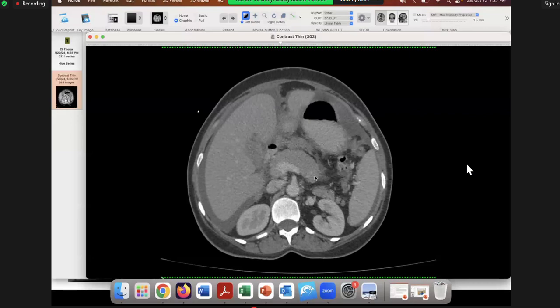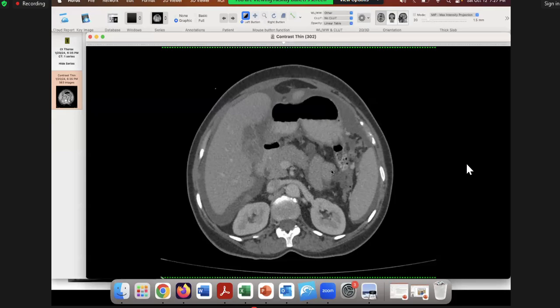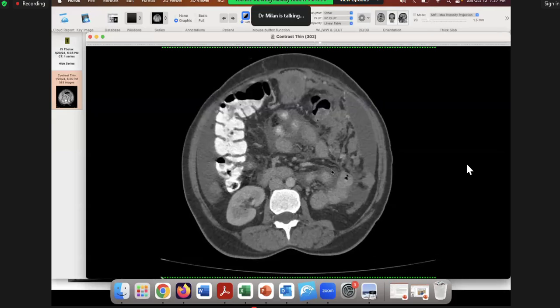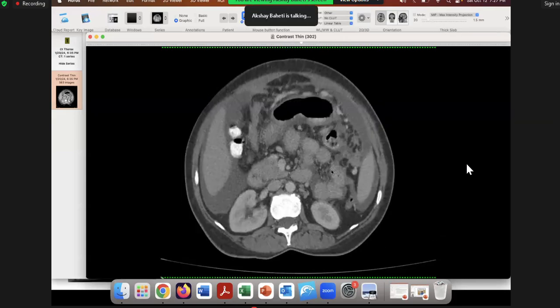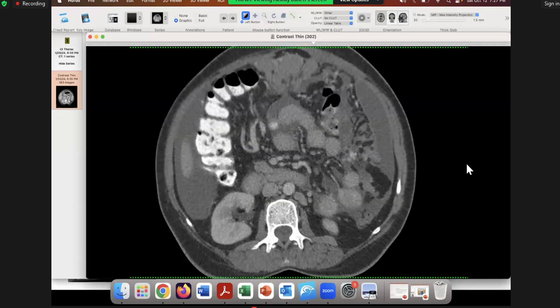So now let's also look at RP, retroperitoneum. What do you think? There are enlarged retroperitoneal nodes. Yeah. So what is enlarged? What is the cutoff? More than 9 in short axis. Okay. 9, 10, right? I mean, generally it's a centimeter. At least that's the one I use. So this is 16 by 8. You can see, or 17 by 8 maybe.